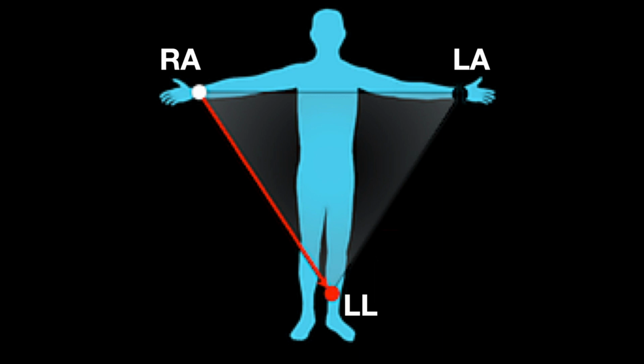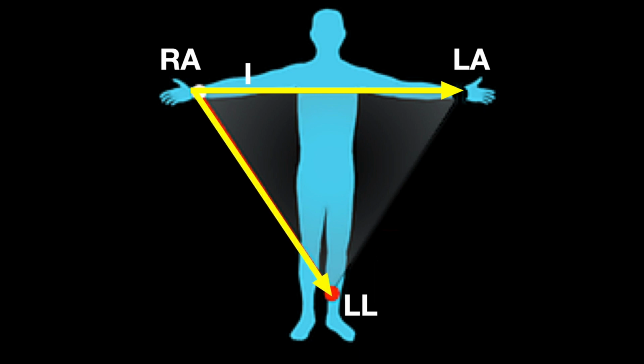So when you measure the current between electrode RA and LA, you generate a line that looks like that. And we call that lead one, and that's what displays in lead one. Likewise, when you measure the current between RA and LL, those again are the electrodes, no matter where you put them, that's what's being measured. You call that lead two. And then LA to LL, the difference in voltage between those two, is termed lead three, and that's just the convention that we write.